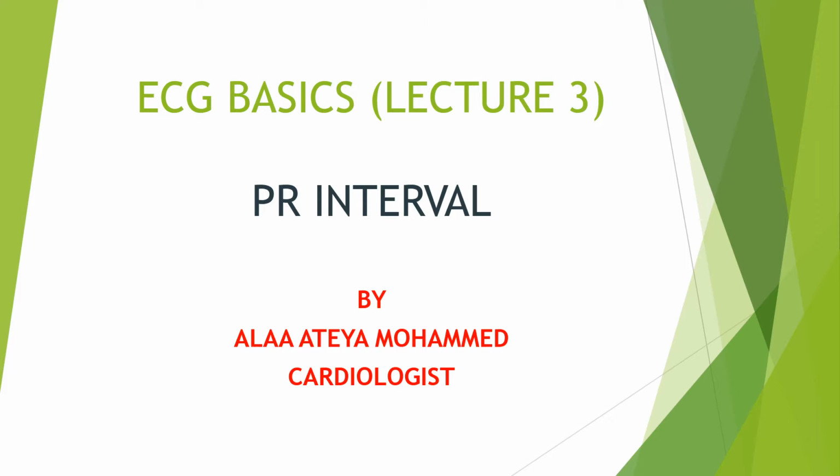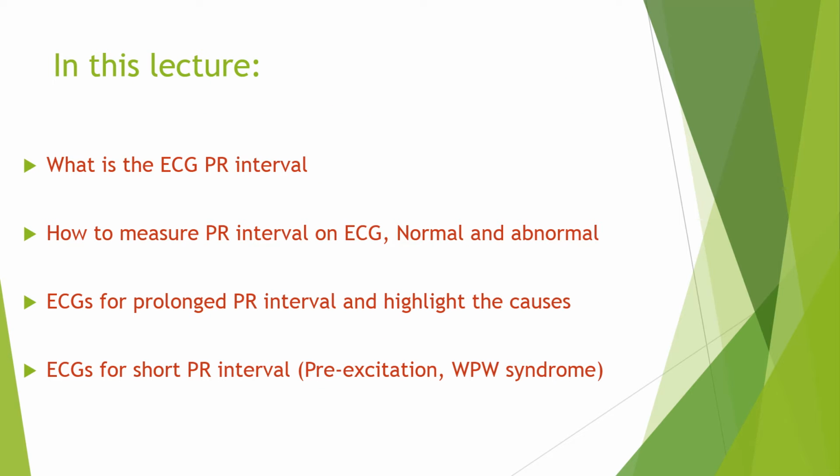We will talk today about the PR interval. In this lecture we will learn what the ECG PR interval is and how to measure it on the ECG, normal and abnormal. We will have example ECGs for prolonged PR interval and highlight the causes, and we will have ECGs for short PR interval like pre-excitation, Wolff-Parkinson-White syndrome.